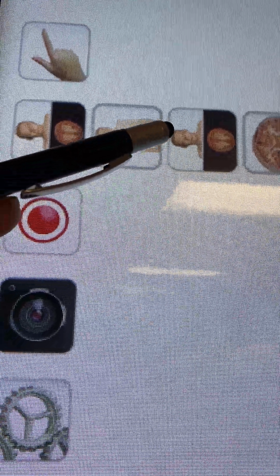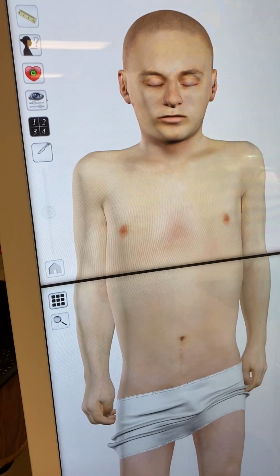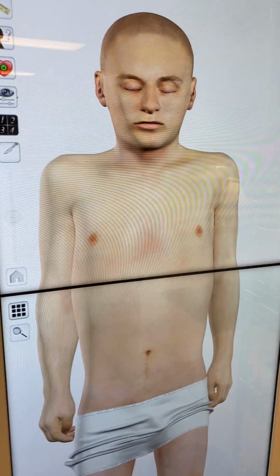You can use the 3D layout here. It brings you back to the first one. It doesn't mean necessarily you always get back to the full cadaver. It depends on what was on your display here.